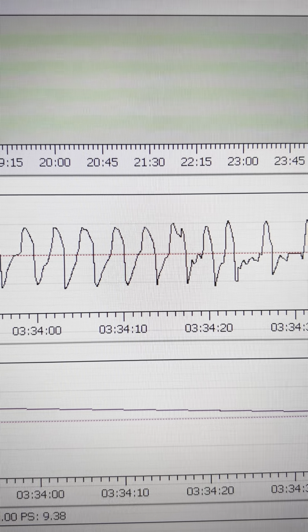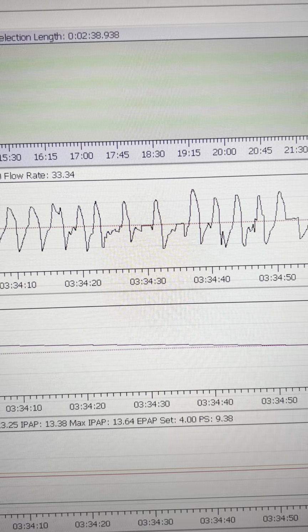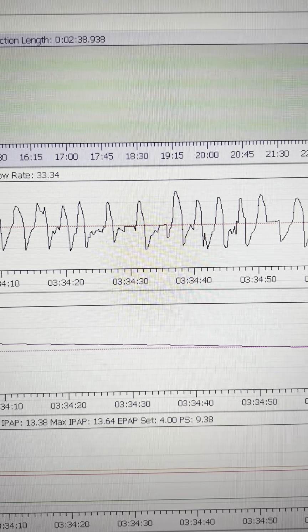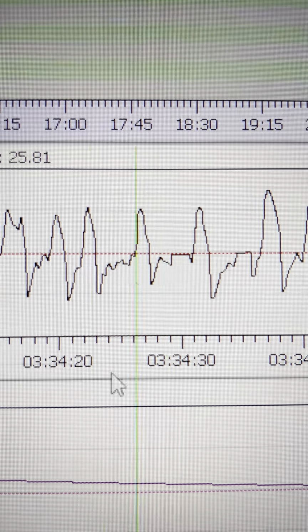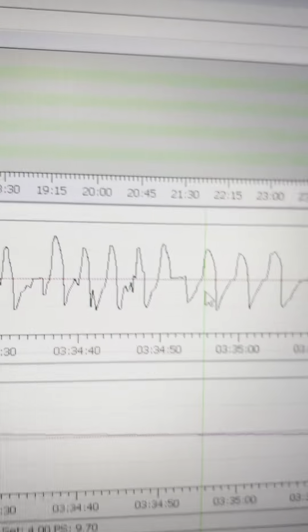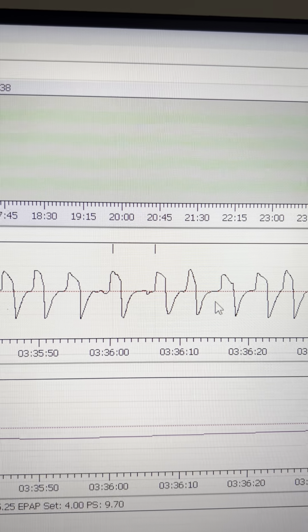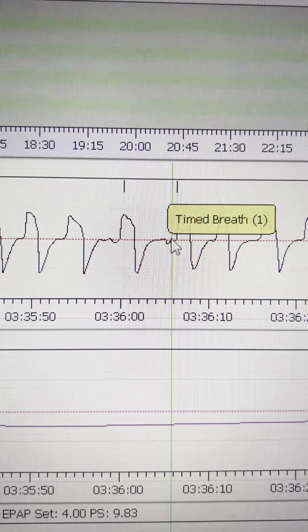Here is just full on, I don't know what's happening here. Maybe I'm turning around, or these are actually me not being able to breathe. I mean, look, same pattern here. Really rough in, really rough in, rough. All of these are really rough. More. Here it's completely cut off, like you can see.